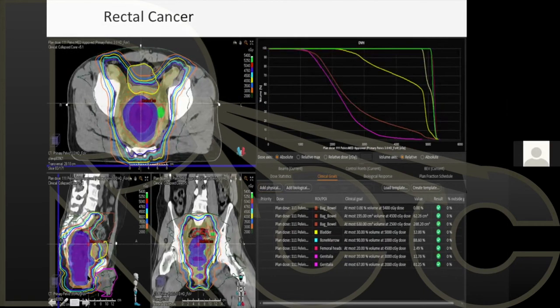So next plan, this is another plan, right? What do we see here? Wow, right? All the hotspots are gone. So that's a good thing, right? My dose, the 50 gray line is covering everything, no hotspots. The bladder is actually getting less dose.